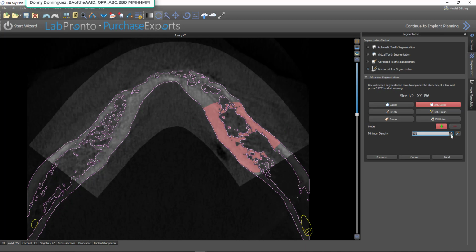Obviously I want it to capture as much as possible. I'm going to keep pushing the boundary until I start seeing excessive scatter. I'm not seeing anything out there. I'm going to reduce it again. And now I'm starting to see that. I'll Control Z, and 475 looks like it's the number.